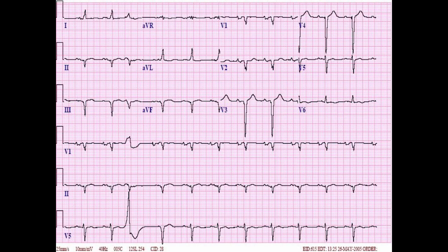On this third EKG, it's a little pixelated, but we can get through it. Let's start with rhythm. We've got this normal sinus rhythm, or at least a sinus rhythm. Looks like we've got a few running leads down at the bottom. Axis, lead 1 is upright, AVF is negative. We've got a left axis deviation. Let's split those into physiologic or pathologic. Lead 2 is negative, so I have a pathologic left axis deviation, so that starts to make me think of a left anterior hemiblock, right?